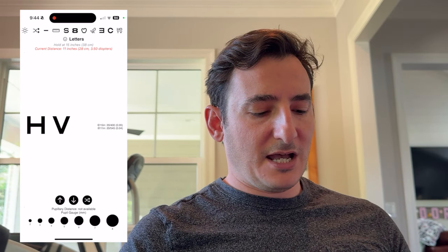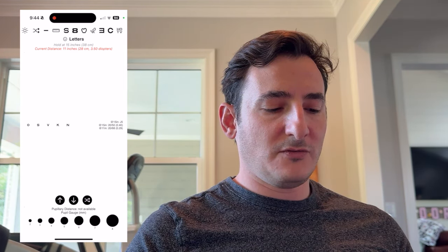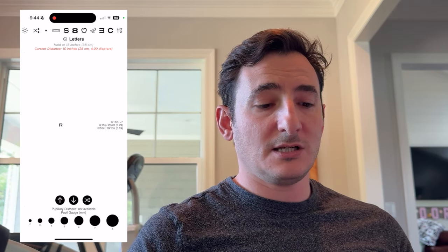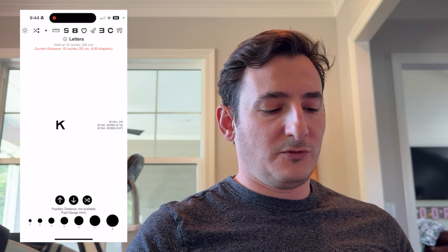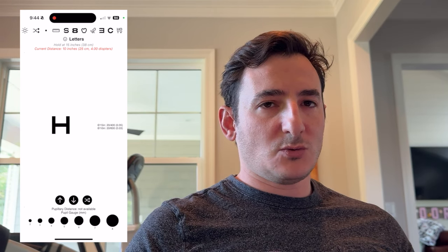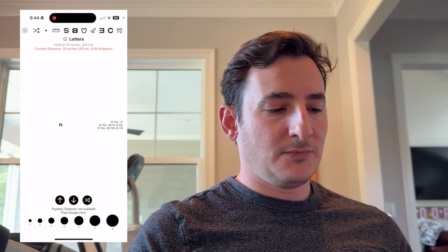You'll see there's down and up buttons at the bottom of the screen in the single row mode. And also adjacent to these down and up buttons, there's a shuffle button, so you can quickly shuffle and just navigate up and down the various rows. If you tap one more time, you'll be presented with the single optotype mode. I find this helpful for pediatrics, where it might be a little confusing and you just want one picture, one optotype, and again, same controls are maintained throughout. And if you tap one more time, you're again presented with this default screen.